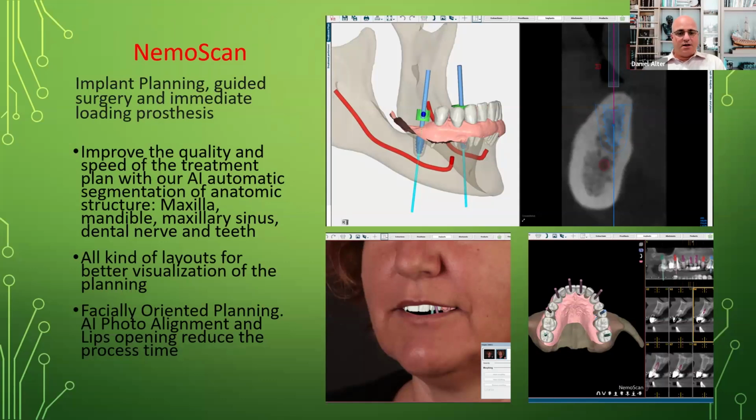And I agree, that may very well be where the bone was, but that's not the only place where the bone was. That's the benefit of software such as this, where you can bring in the DICOM file, which I'll discuss in a second, as well as the static scan, to garner information on bone density. Now we can place the implant virtually, in exact density markers, so that we know it will osseointegrate well.